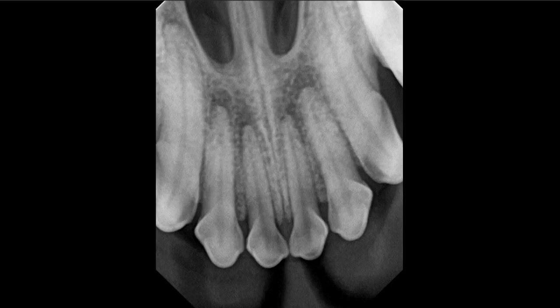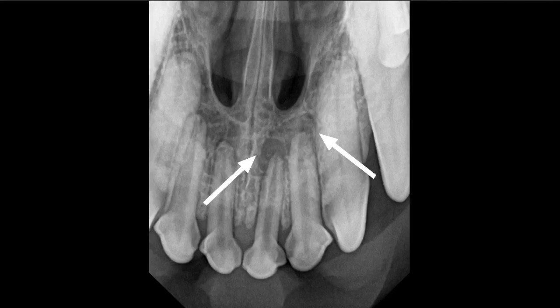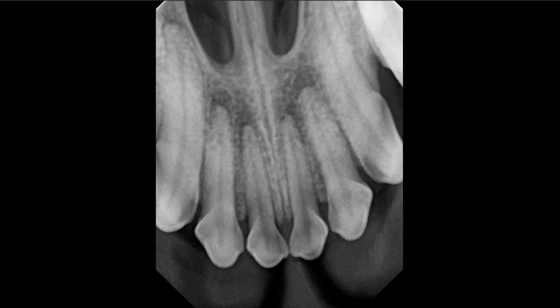Now, you cannot read in those lucencies like we see here into maxillary incisors on a consistent basis, because we see a lot of the chevron sign or a lot of lucencies around normal incisors too. So you have to be really careful in interpreting those changes.